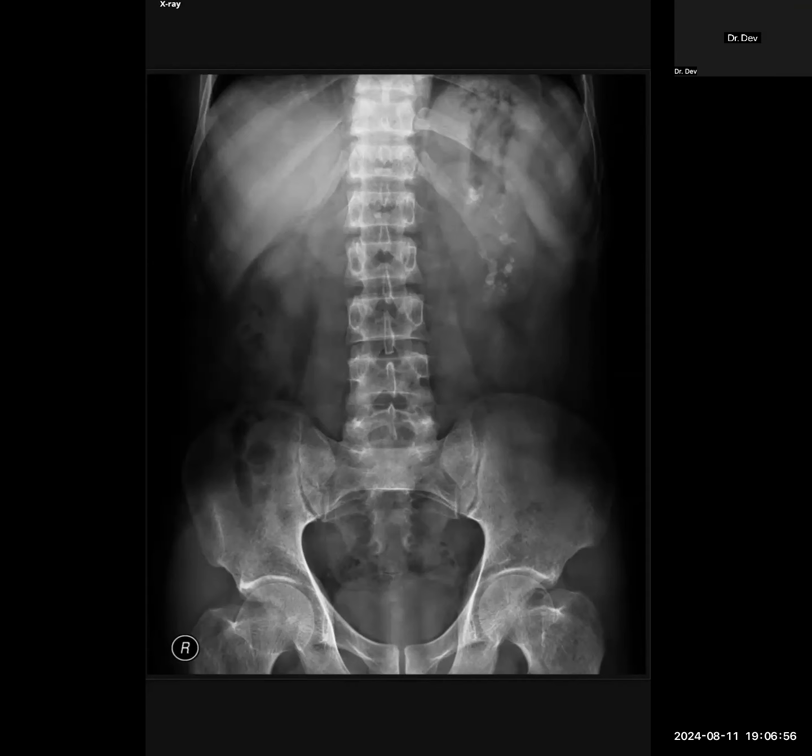Thank you. Apart from lab parameters, would you look for anything in the imaging itself that can give you a clue about the etiology? Yeah, in medullary sponge kidney, usually I would check the IVP images if available. IVP images will show a paintbrush appearance in the post contrast images. Other than that, I can also check if there are any associated brown tumors and any features of hyperparathyroidism such as clavicular erosion, all those things.